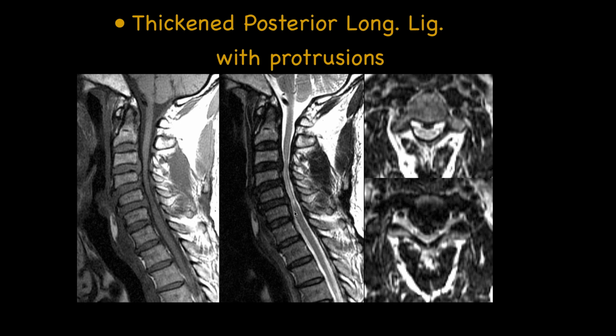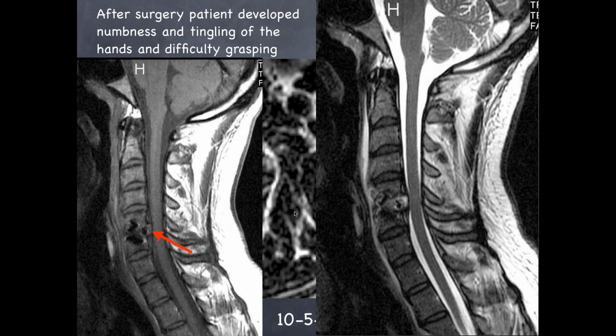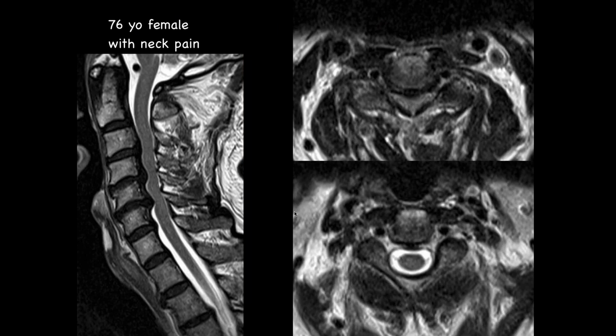How old is that patient? Young patient. I don't know, we don't have the age in this particular patient. What's with the thickening of the posterior longitudinal ligament? That's a finding that can be symptomatic. Here's another patient. Let's see who's next.